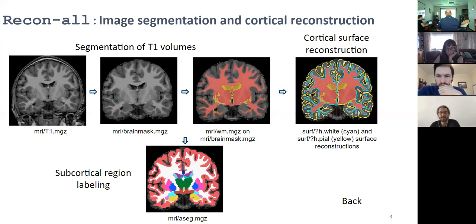One interesting thing, Alfonso, if you remember, when we did the pipeline 1.0 a long time ago, it was called the Speech Lab Toolkit. At that time, we were normalizing all the scans to MNI space. And because we were doing that for the fMRI, we just did that for all of them. It does have some advantages in that the brains are all nicely aligned to ACPC. I think it's easier to wrap your head around the anatomy that way.